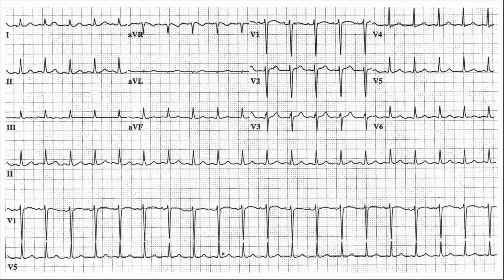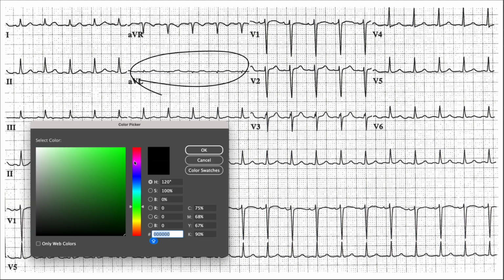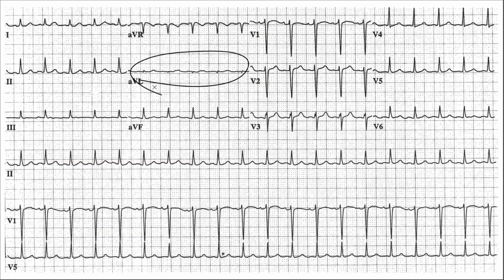All right, first thing that stands out to me here is, whoa, and my colors are not my friends. There we go. AVL again. In the previous video, we had AVL issues as well. So AVL, you want to check out AVL and see what's going on here. If it's a mechanical issue, double check your electrodes, wires, machine itself. If this is coming from the heart, there could be a potential issue. You do not want to leave AVL alone.